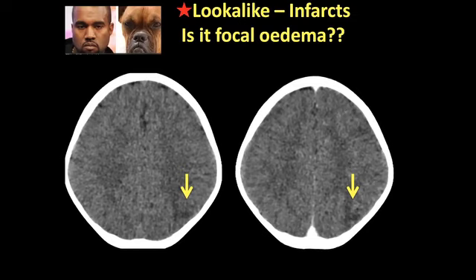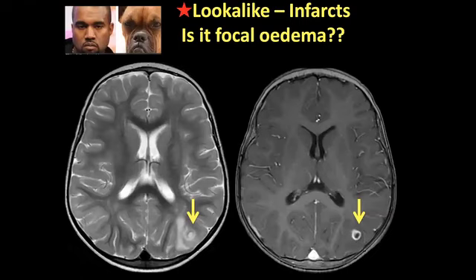They were going, is it an infarct? Is it something else? Are we missing something? Well, yes, sometimes on CT we do miss it. So when we look more closely, in fact, this was neurocysticercosis with surrounding edema. And yes, is this a good use of resources? Probably not, but at least the patient then didn't go on to have an extensive workup for TB or get put on TB treatment, and we were able to diagnose the condition.